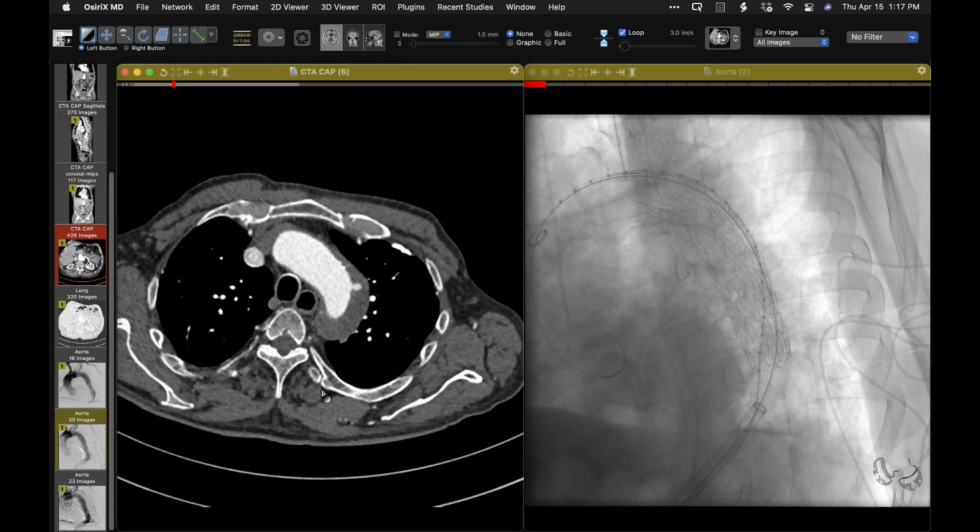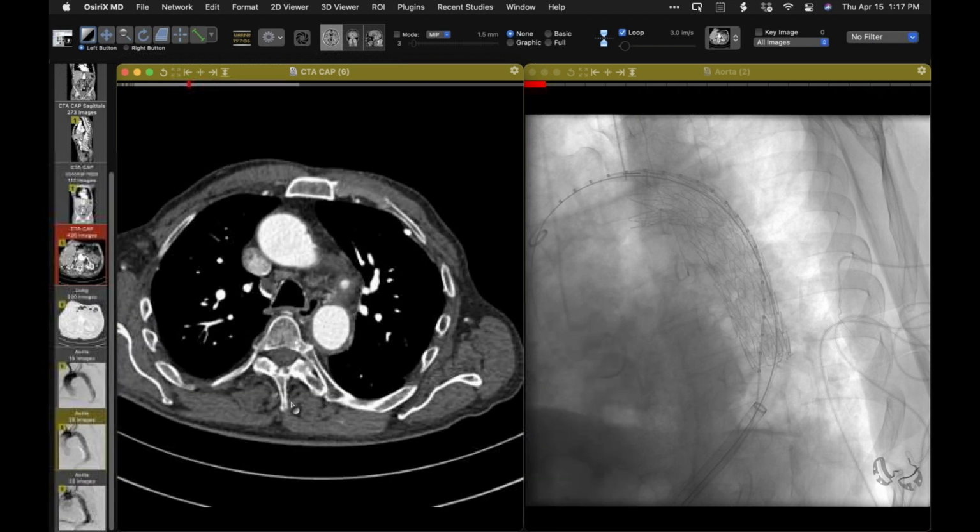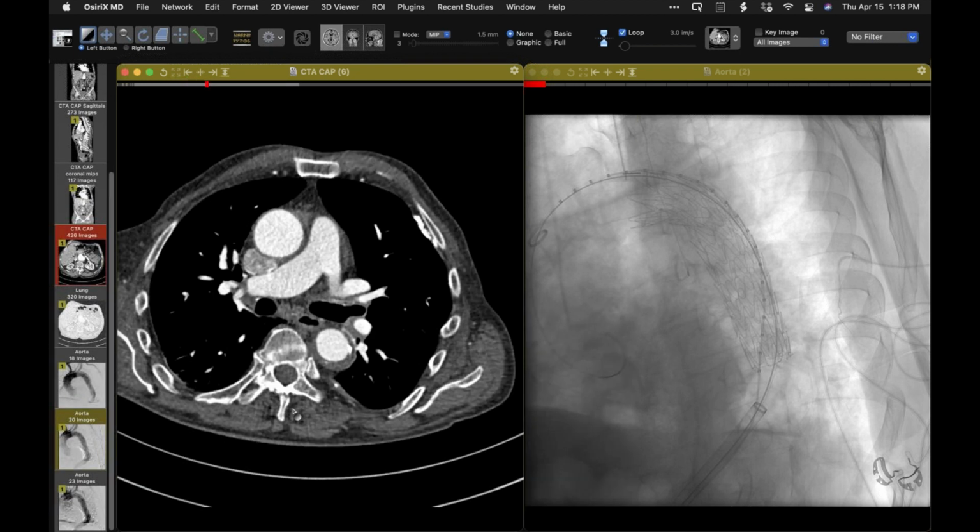They stented that anyway, and so be it. But I'm kind of skeptical that this is a separate new pathology, the PAU. I think there may be an ulcer-like projection related to that dissection, but this visually does not look like a hyperattenuating hematoma to me. I don't know what you guys think. Yeah, I agree with you, Howard. I don't know what other people think.